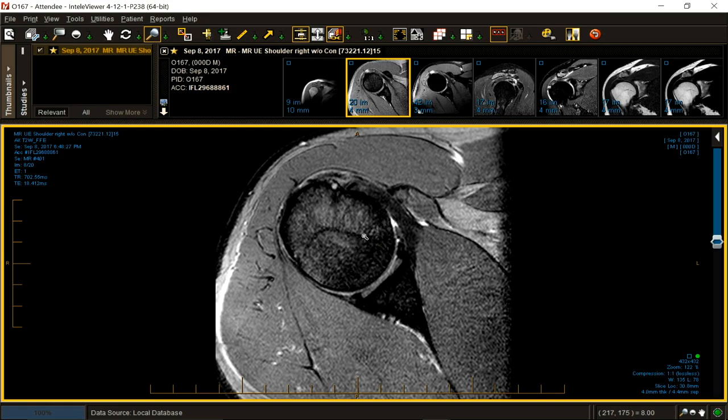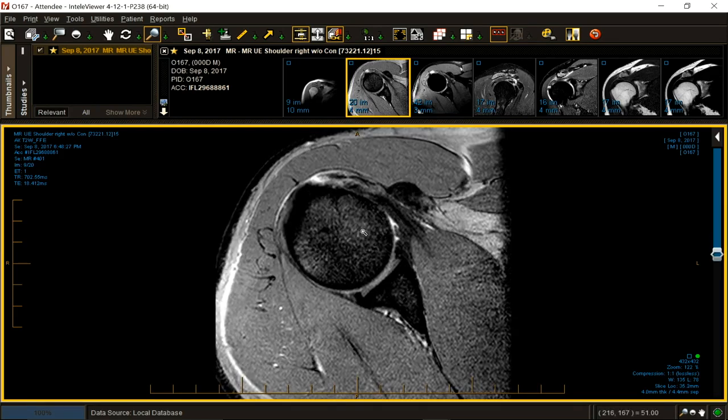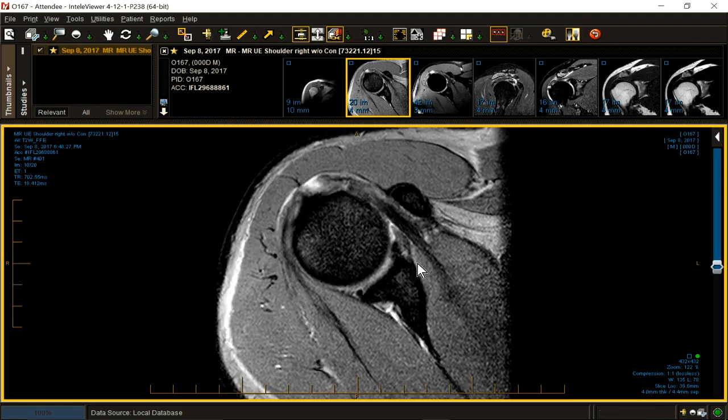So if you're reading on different equipment, you've got to learn how to read off that equipment. Fortunately, most of you are reading off of only one type of equipment. But it absolutely influences how I read the case and which sequences I use. This time, I don't have a lot of fat suppression, but I do have a gradient echo. So I know it's articular sensitive, it's got pretty good water sensitivity, it'll be good for tendons, but it isn't fat suppressed.